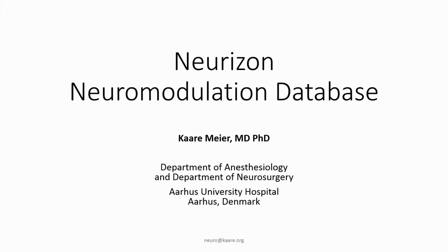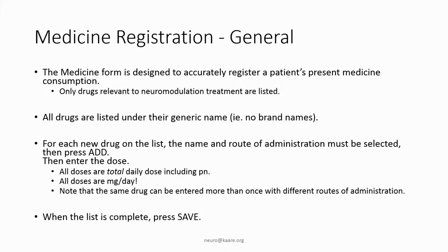This video will demonstrate the details of the medicine registration module in the Neurizon Neuromodulation database. Now, the medicine module is designed to give an accurate registration of a patient's present medicine consumption. That is, it is a spot registration of what medicine the patient is actually taking right now.